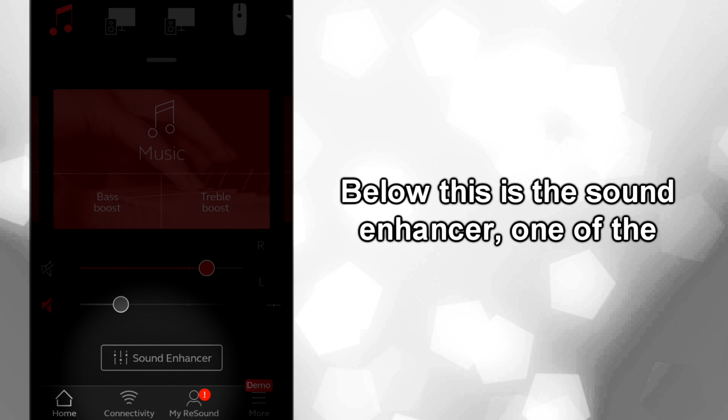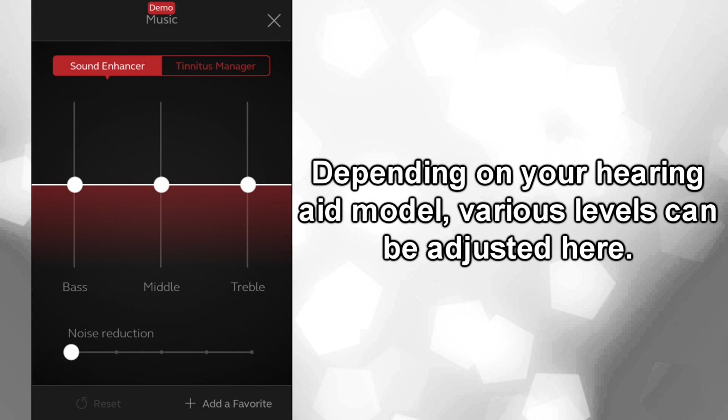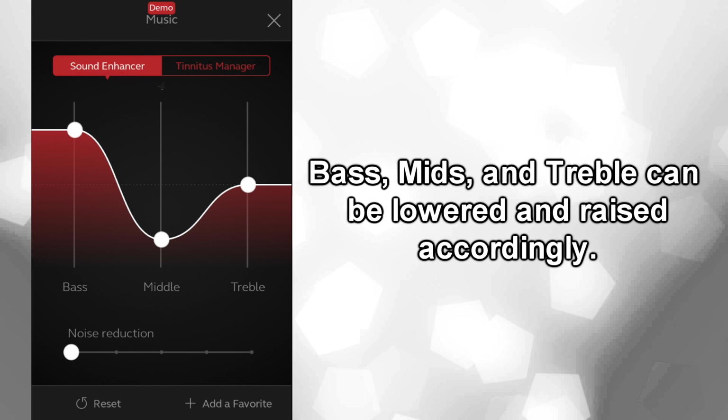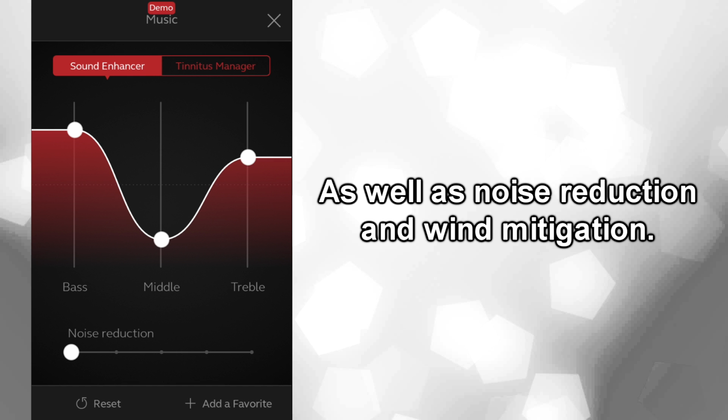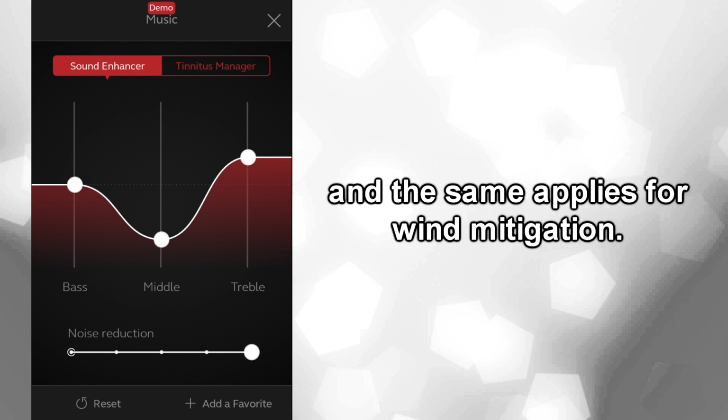Below this is the sound enhancer, one of the standout features of this new app. Depending on your hearing aid model, various levels can be adjusted here. Bass, mids and treble can be lowered and raised accordingly, as well as noise reduction and wind mitigation. The noise reduction goes up in stages from off to strong, and the same applies for wind mitigation.